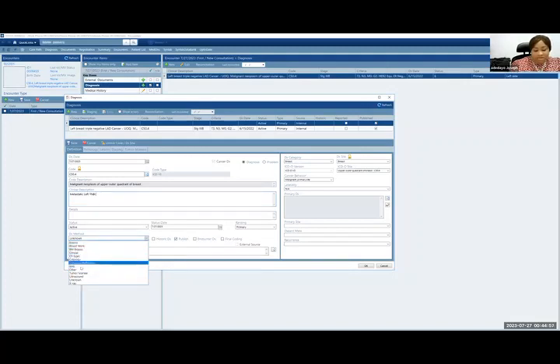So MRI, let's say it was PET-CT and PET-CT is not here. You can select other and then come here and say PET-CT. Was confirmed on PET-CT. The status date is today. So as of today, this woman is metastatic on PET-CT actively. And what is the ranking of this disease? It is still primary, right? And then it is still breast. And we still need to confirm the laterality, which is the left side.